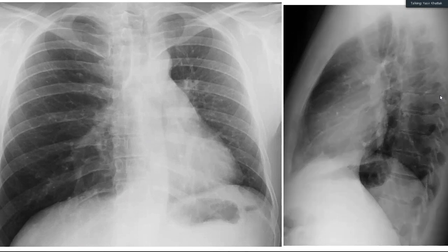All right. So you mentioned that there is increased translucency or hyperlucency on the right side. Yes, sir. When you fix your findings on such a thing, you have to exclude whether there's a technical factor involved in this particular X-ray. Yes, sir, the patient is more rotated toward the right side. So that's very important, but you do not bring it up first. You stick to your main diagnosis and differential on the basis of your preliminary finding, which is left-sided volume loss, is it?